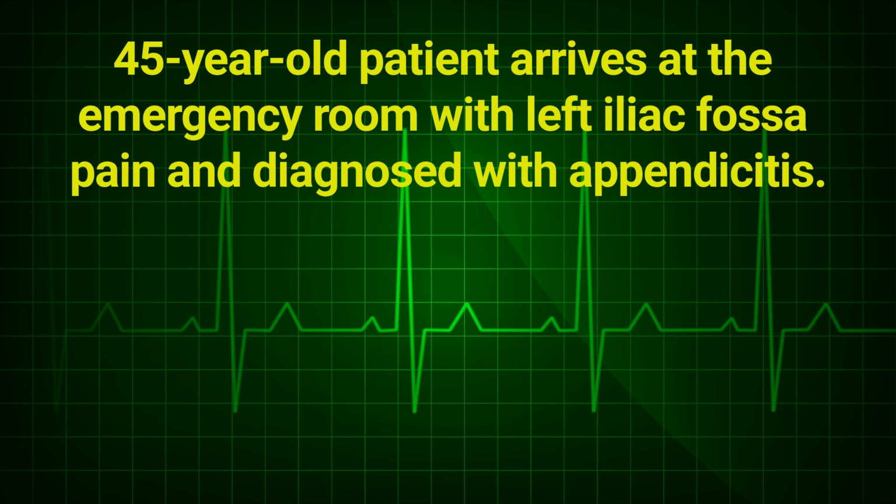A 45-year-old patient arrives at the emergency room with left iliac fossa pain. They undergo an ECG before having an appendectomy, meaning they arrived with left iliac fossa pain, were diagnosed with appendicitis, and had an electrocardiogram performed before surgery, which we will see shortly.